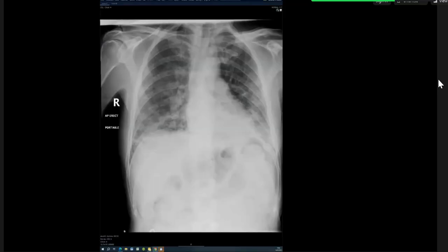So the patient is a 78-year-old with increasing cough over the last 2 weeks. Okay, I am presented with a plain X-ray of a 72-year-old male with cough for the last few days. From the first instant, I can detect that there are multiple opacities seen at the level of the right lung lower zone.